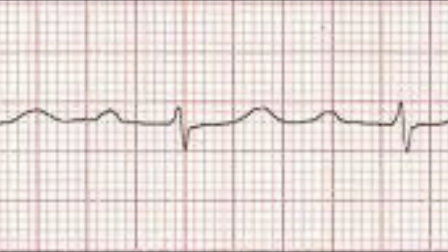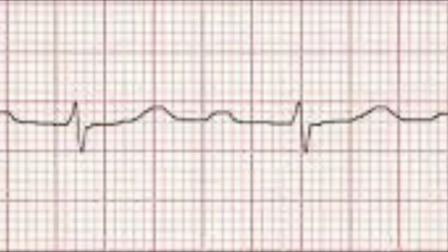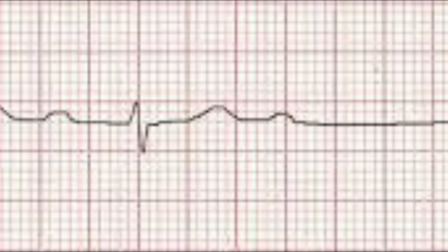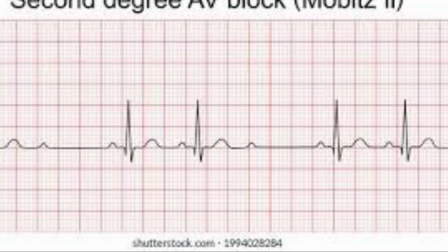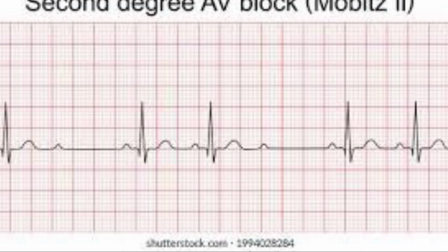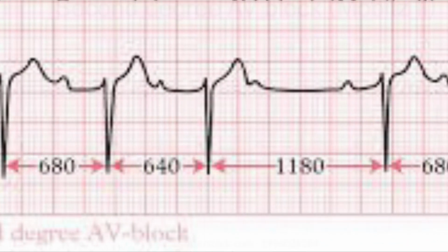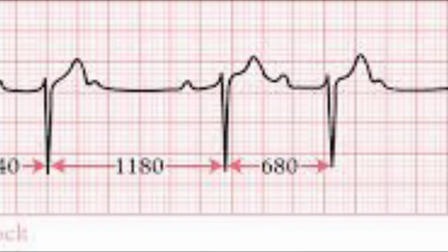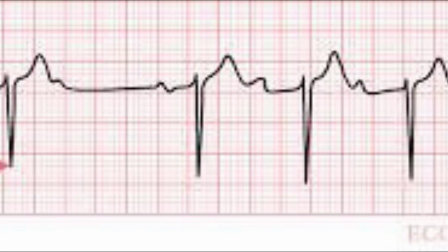information to go over. So when it comes to Mobitz I, Wenckebach, as the electrical impulses travel to the AV node, each one is delayed a little longer than the previous one, and they can eventually drop. When it comes to Mobitz II, classical, that's when the AV node selectively allows some beats to get to the ventricles while others are blocked. So take a look at these examples, and then we'll get into how we can identify them.